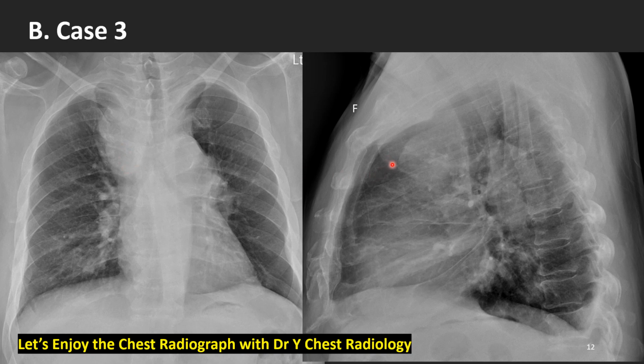In the lateral film, this is a huge bulging contoured visceral compartment mass. The probable cause is lymph node disease, and both hila are enlarged with lymph nodes, and there is pleural effusion in the posterior costophrenic angle.